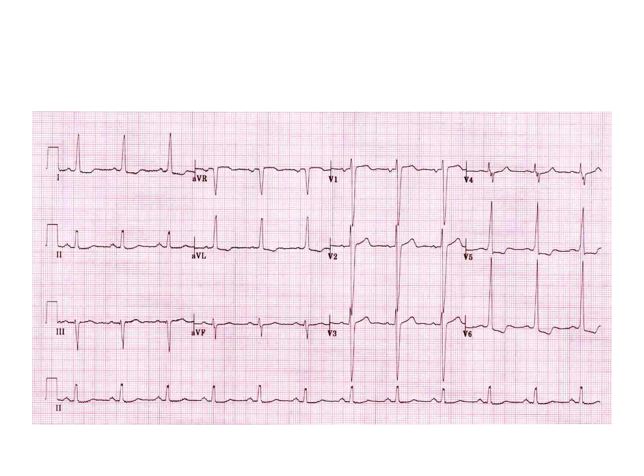So this is an example again of left ventricular hypertrophy, and again look at leads 1, aVL, V5, V6. You will see that there are downsloping ST depressions, but they are appropriately discordant with the upright QRSs. So we really can't tell much more from the EKG except that a person has changes consistent with LVH. And how to tell if there is ischemia in the presence of LVH or other conduction problems we will cover a little bit later.